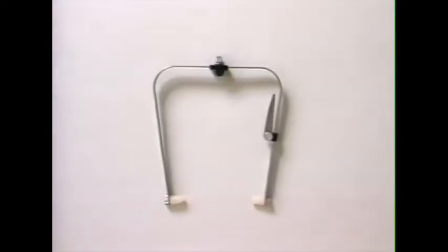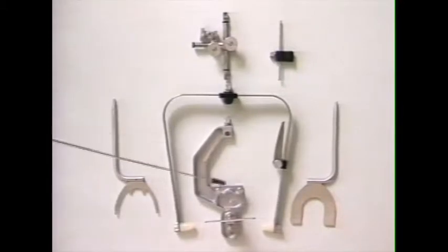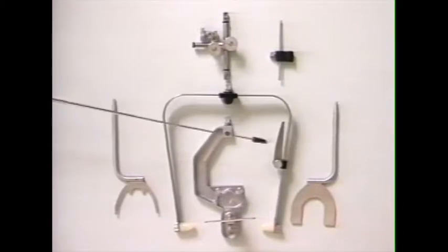The Hanau spring bow is a self-centering ear bow. It allows the dentist to rapidly and easily obtain a facebow record and transfer it to the articulator. It can also be steam sterilized in an autoclave. It consists of the spring bow itself, which is an ear bow which springs in and outward to allow placement into the ears. The ear bow also has an axis orbital indicator on it, which allows the vertical orientation of the facebow.